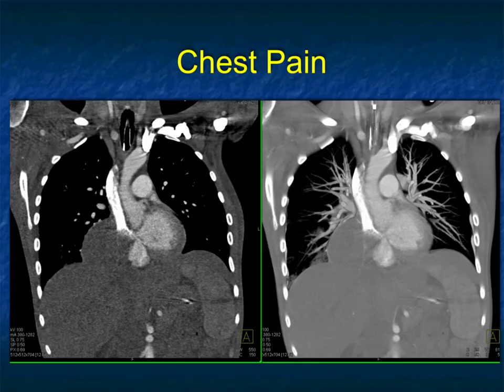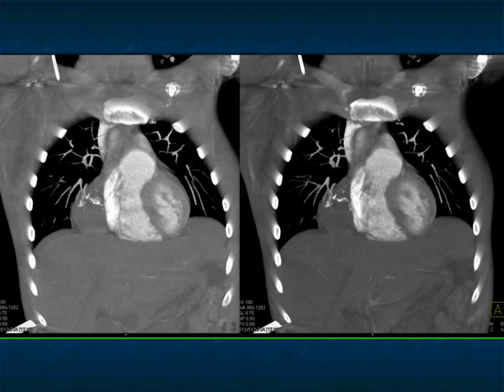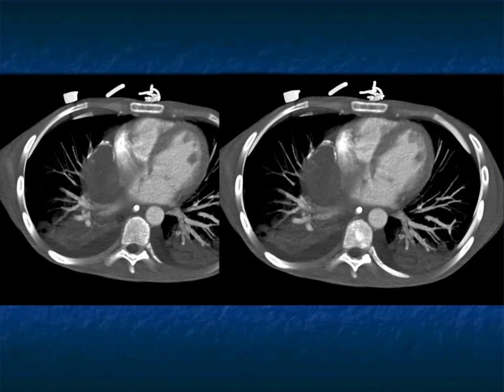This is an unusual case. The patient has chest pain. It's a younger patient. There's a mass by the diaphragm pushing on the patient's SVC as it comes down to the atrium. What's going on here? Could this be a duplication cyst, a pericardial cyst? Could this be some type of cystic tumor? It's really not an anterior mediastinal mass, though it does track a bit upward, but it's mainly near the heart. I'm thinking of all sorts of pericardial type processes.